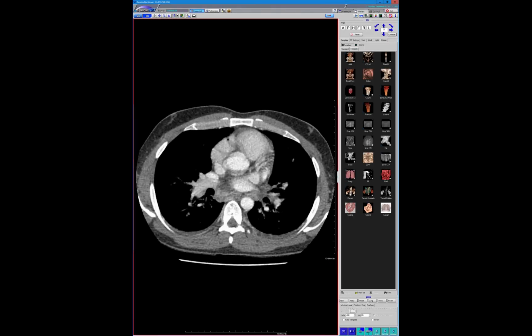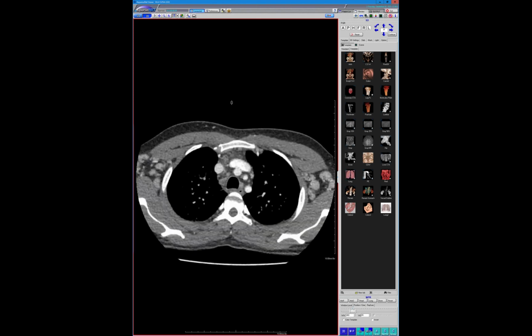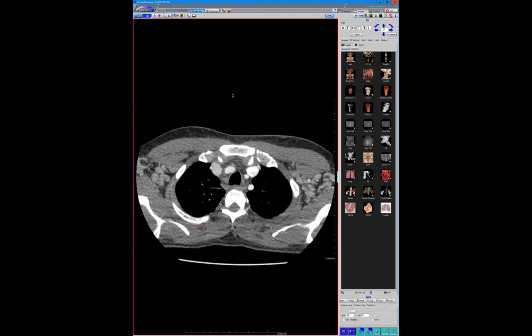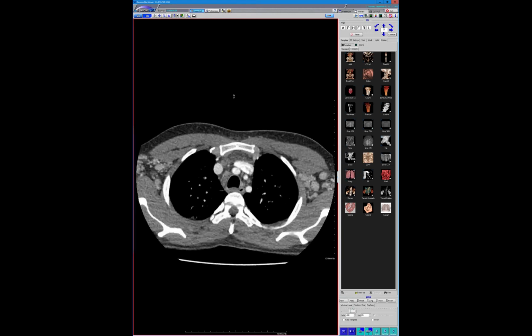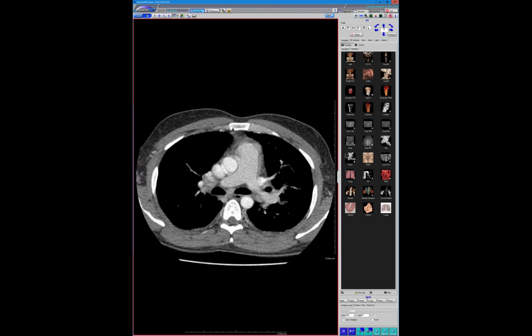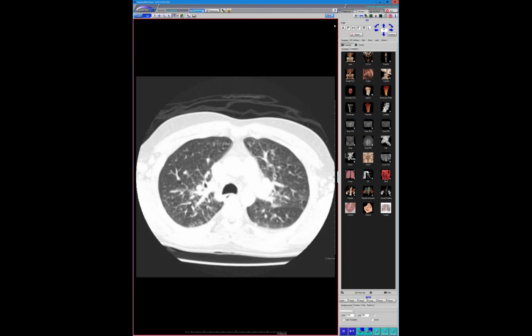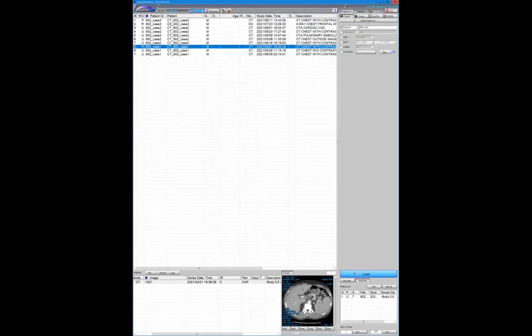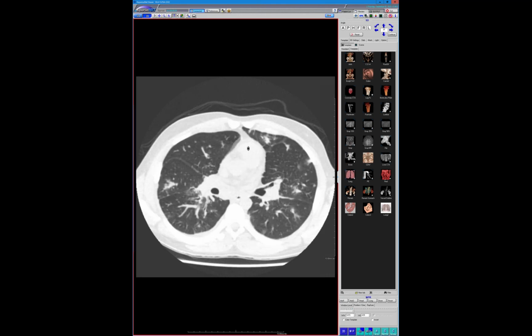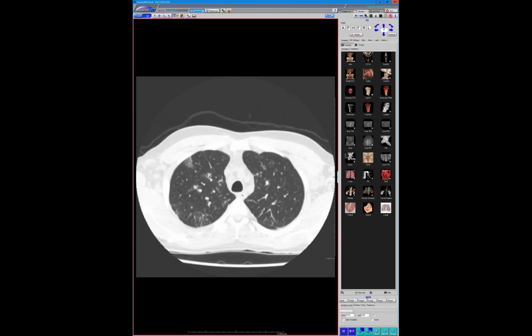HIV is commonly seen with HHV8 superinfection or co-infection. And HHV8, as we know, is associated not just with these very large lymph nodes, which happen to be secondary to multicentric Castleman disease, which we see in HIV, but also, though this one doesn't have the best lung imaging because he's breathing, with Kaposi's, or Kaposi's sarcoma. I don't know how people would like to pronounce it these days.